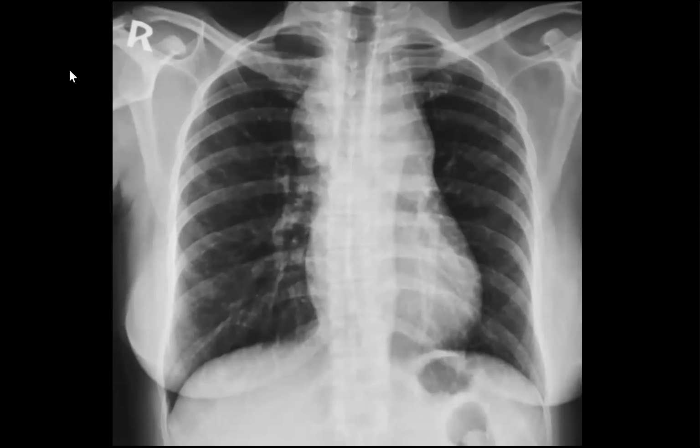Sir, I'm provided with a chest X-ray, frontal projection, of a skeletally mature patient. The obvious abnormality I can see is a mild anterior and superior mediastinal widening, and there is also widening of the right paratracheal stripe.